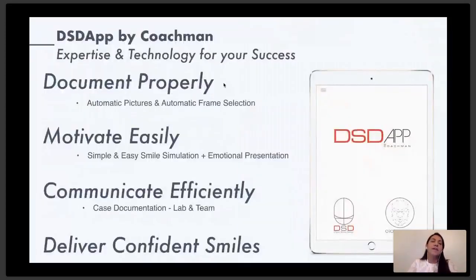The DSD App can help you in several different ways. It can help you document properly by having all of the pictures, all of the STLs, all of the radiographs in one spot. So you're going to have everything stored in the DSD App. Then you're going to be able to motivate your patients easily using simple smile simulation and emotional presentation to show them and present that smile plan or smile journey.